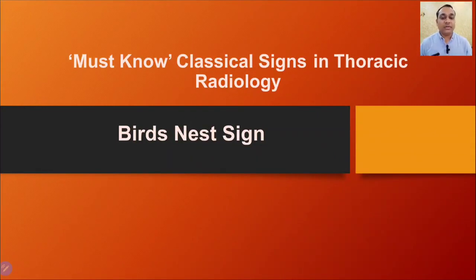Today I am back with one more very important sign, which is called the bird nest sign. So in today's lecture I am going to discuss what the bird nest sign is, how to identify the bird nest sign radiologically on CT scan, and what are the conditions in which the bird nest sign is present, with a few examples. So let us start with today's lecture.